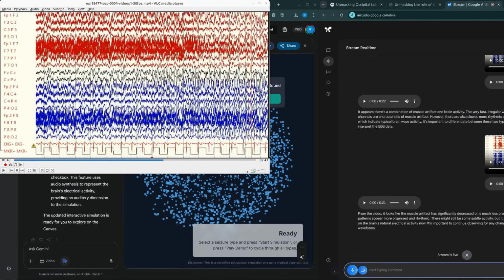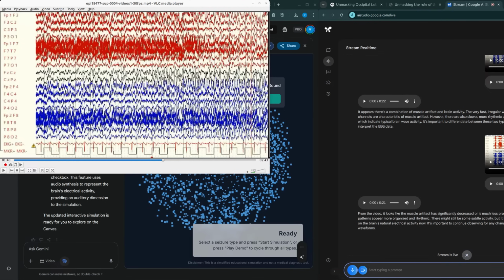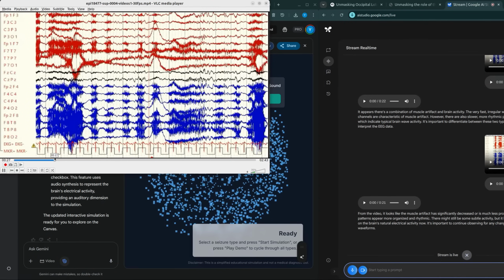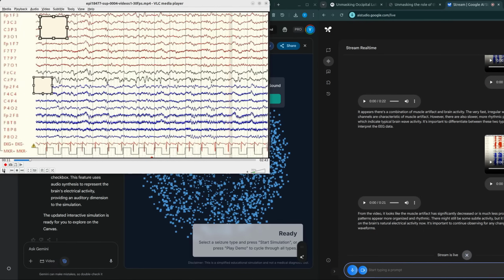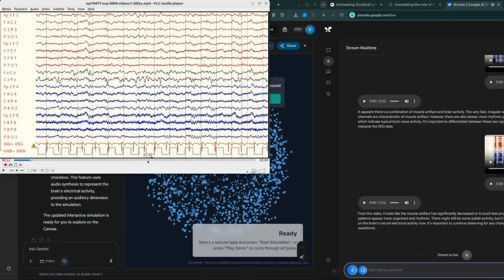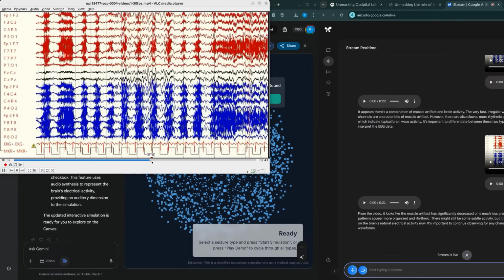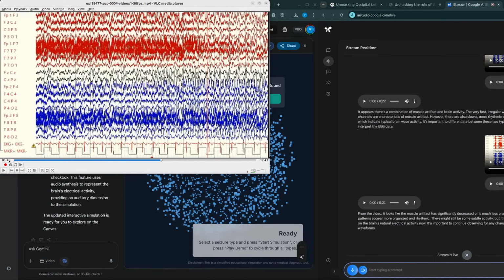Okay, that's a bit weird. Wait a sec. Can you look at this time window over here, and what difference does it make compared to this image here? What difference are we seeing? So second 12 compared to 1 minute and 40 seconds.